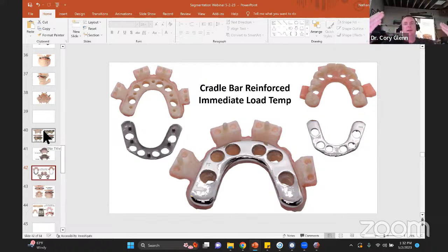So you can pull this off with Trilor, but I found it difficult to get it to all fit in there. The smallest Trilor arch bar dimension is 3.5 millimeters thick, up to 7.5 millimeters thick. So you end up with quite a bit of your vertical height, 3.5 millimeters of this overall 16 millimeter thick restoration is going to be Trilor.